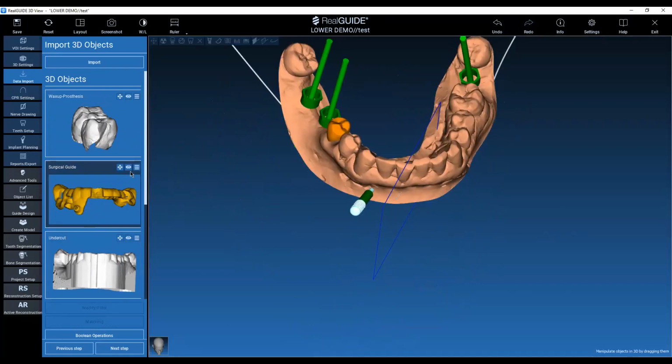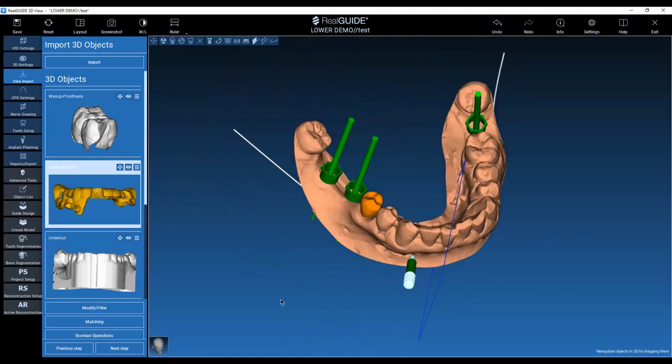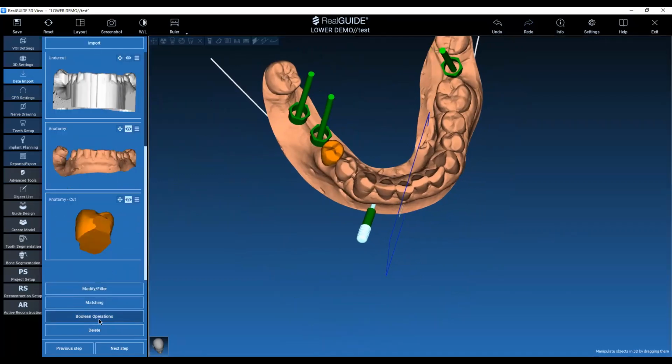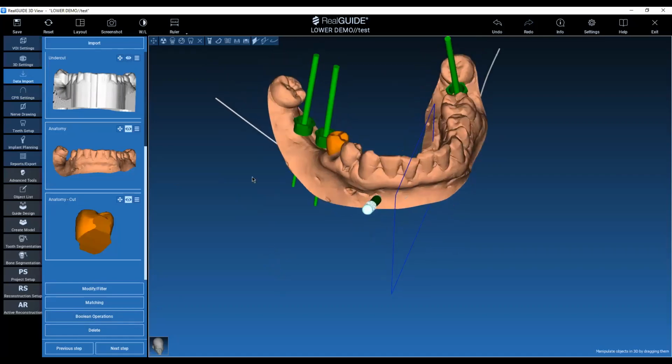Okay, let's suppose I want... any idea, Luca? What do you think? But only I think that they want to see only where they can do this, not an example. No, because I don't have any object to subtract from the complete.